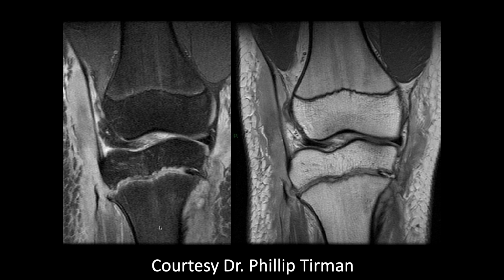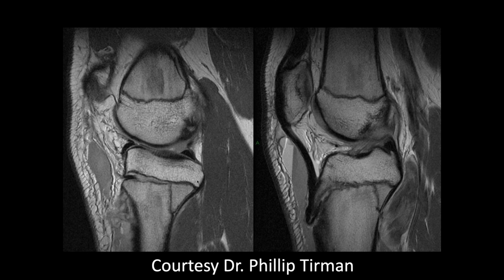So there are a couple of things here. You can see that the periosteum is torn here. That lets you know that it's really an injury. Otherwise, the periosteum should be intact. The other thing you can see here is that the periosteum on the medial side has flipped into the growth plate area. Invagination, right. And then obviously we can see that the metaphysis is involved here and the periosteum is involved there.